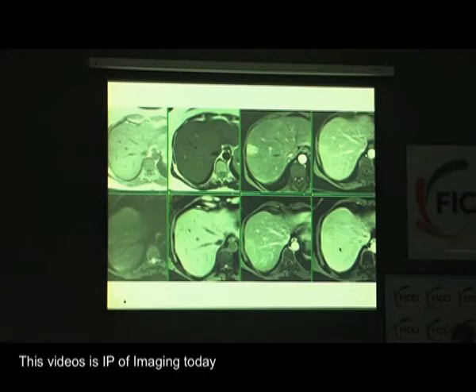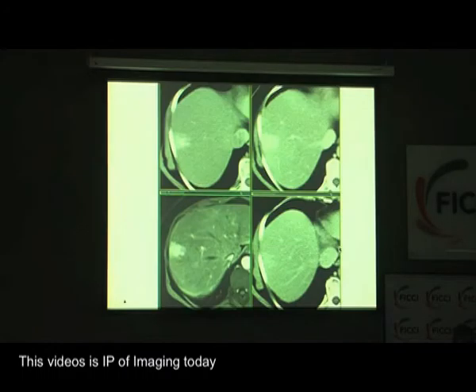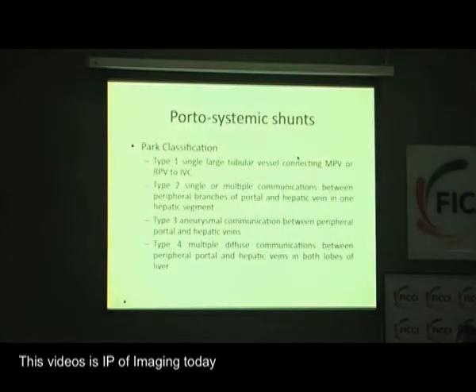And that's the hepatobiliary phase where again the lesion is not seen. This patient also had a prior CT, which the patient was able to give to us after we reported the MR. And on the CT, you can see this little abnormal vessel in the center of the lesion, which is also seen on the MR study. And that's the portal venous and hepatic vein phase of the CT, showing that the lesion fades or remains slightly hyperdense to the rest of the liver.